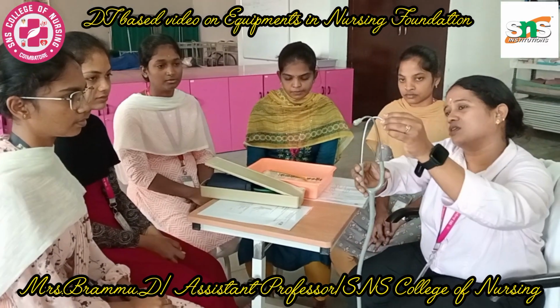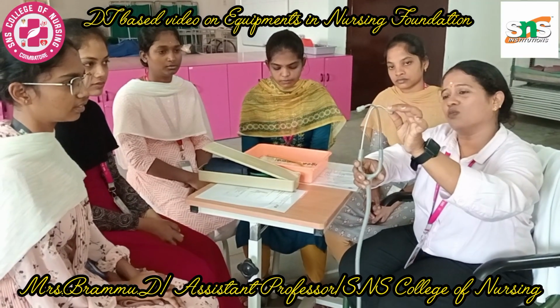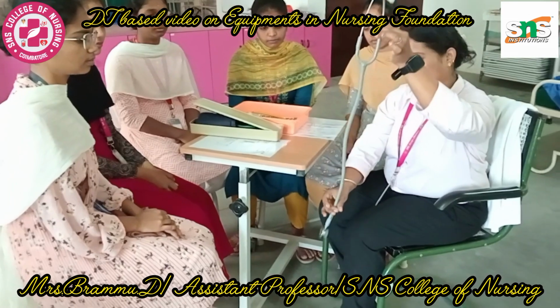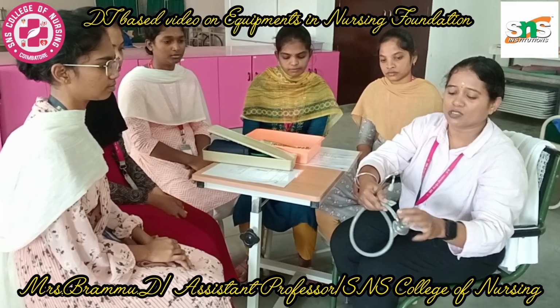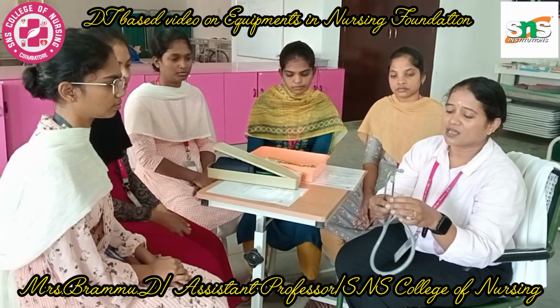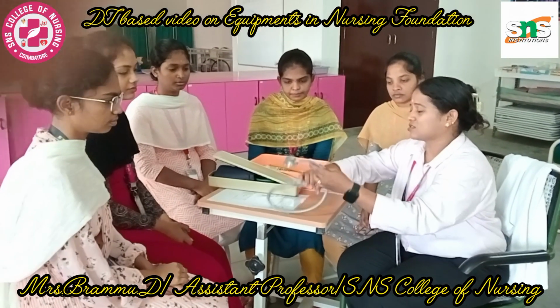So starting from the earpiece, you have two earpieces and two ear tubings, and this end will be placed onto the ear. Followed by that you have the binaural spring, and then this is connected to one single tubing. Followed by that you have the stem, which connects to the chest piece. The chest piece again has two parts, the diaphragm and the bell of the stethoscope. So that's all about the parts of the stethoscope.